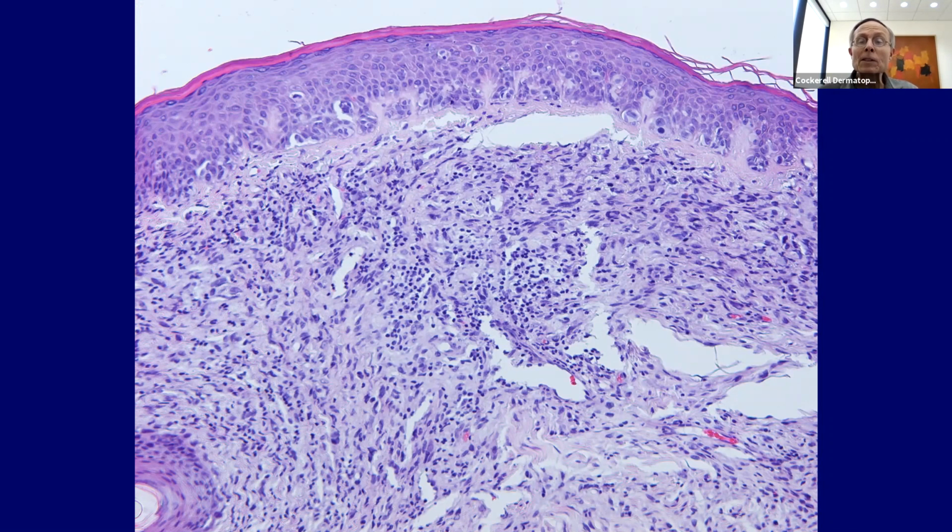So let's look at the blood vessels. Are there any features there that look unusual, or any endothelial cells floating freely in the lumen? Some of these are blood vessels, but some of them are just spaces like here and here. And there's none of that. There's no large endothelial cells, so it's probably not a vascular neoplasm. Could be, but that'd be less likely. It's in the dermis. So again, it could be maybe a fibrohistiocytic process.